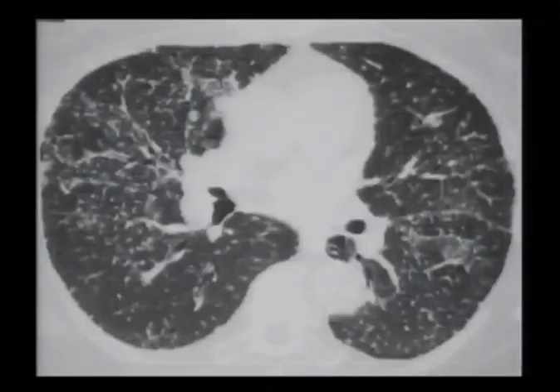That may just mean that there's obstructive disease on top of it. That's the one pitfall. But once in a while, it may make you think that you're dealing with something funny, like maybe a weird case of sarcoid or something like that. This does not look upper lobe predominant like sarcoid would be. But it certainly doesn't look like usual interstitial pneumonia either. Those lungs are usually far more physiologically restricted. Here's a patient's CT scan. So Rick went over this, and I'll go over it again.